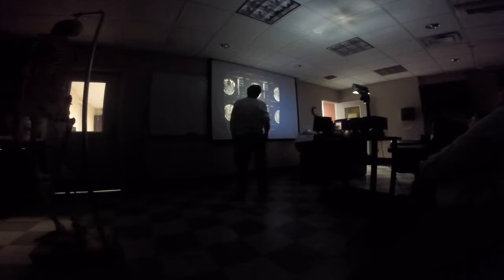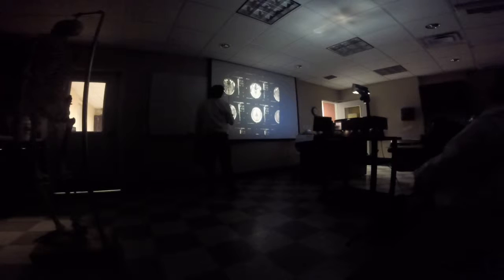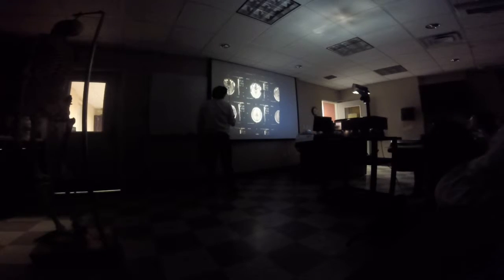I guess it was probably meant to ask what lobe that is. Okay, frontal. And I think that's going to be part of the temporal lobe. By the way, what is this right here? Part of the brainstem, midbrain? But that's going to be the pons. If it was the midbrain here, you'd see the cerebral peduncles. But this is a little bit more inferior.